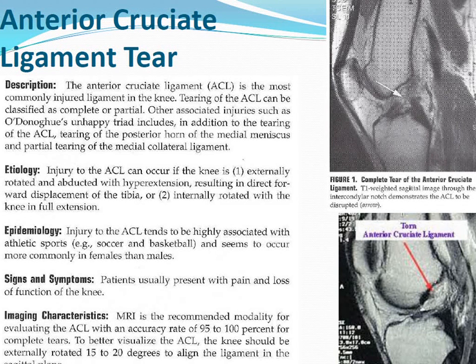So you'll be doing a combination of figuring out whether the ligament is torn or not, and also seeing what the other consequences are, and see if there's any cartilage injury associated with it. So the orthopedic surgeons can often diagnose this on physical examination because the anterior cruciate ligament prevents your lower leg from being pulled forward at the knee. So they'll be able to tell that it's just a little bit too lax when they pull on it, but they won't know the extent of the tear. They won't know what the other associated injuries are with it until they get an MRI, and so that's where it's important to do the MRI.